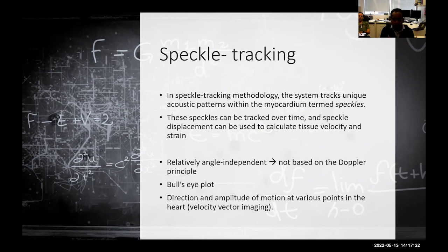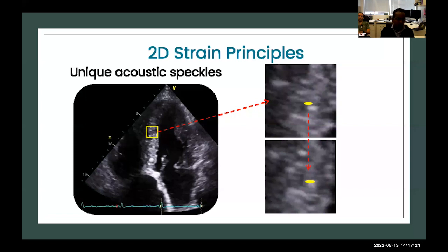This is like a thumbprint or fingerprint of the myocardium. The software is able to recognize this thumbprint or region as its own identity, track those movements of the myocardium, and measure the deformation, in terms of how much it has changed from before and after.